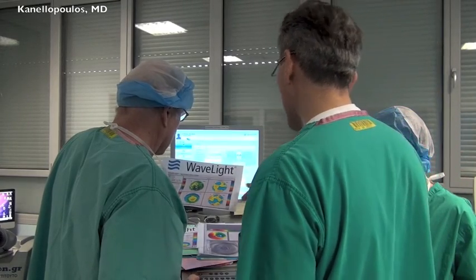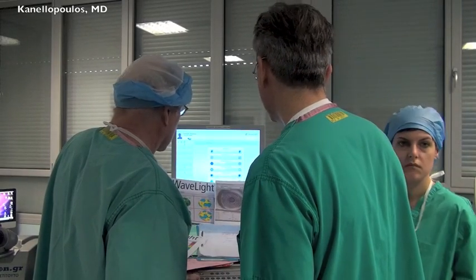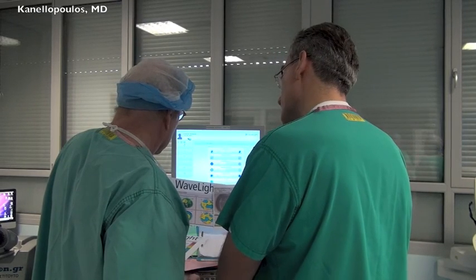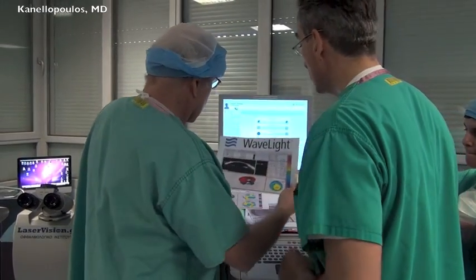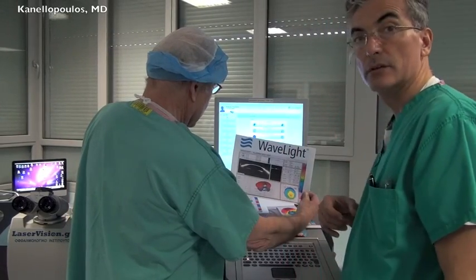So this is the pentacam. This is the placido. And here we might see differences. We're going to feed both, but this would be a good example where we would use placido disc versus pentacam because this is a patient who has a significant cornea scar that has developed this significant flattening under the center.